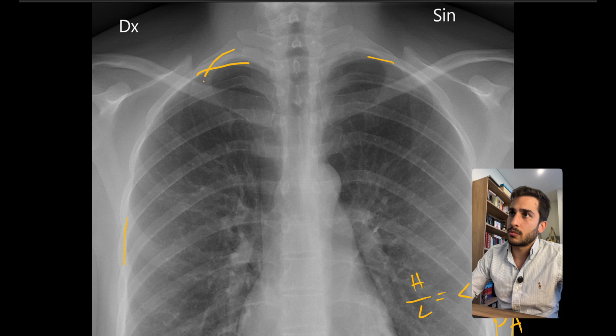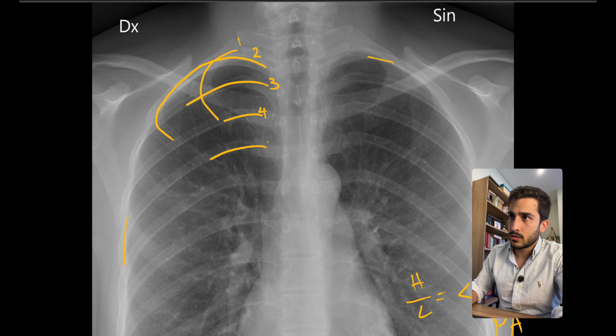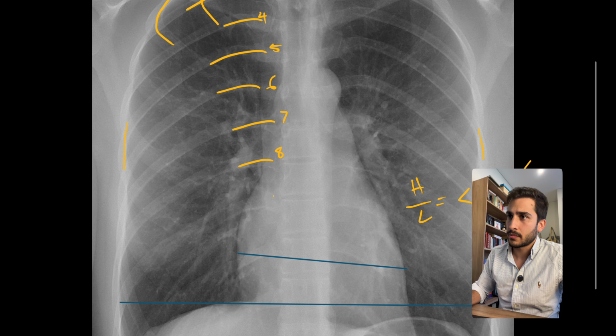So this is rib number 1. You might actually rub out this top one so we see exactly what's going on. This C-looking shape here, that's rib number 1. Then this one right below it, that's rib number 2. This is rib number 3, 4, 5, 6, 7, 8. I'll scroll down, 9, 10, and a tiny bit of 11. Okay, so that's pretty good.